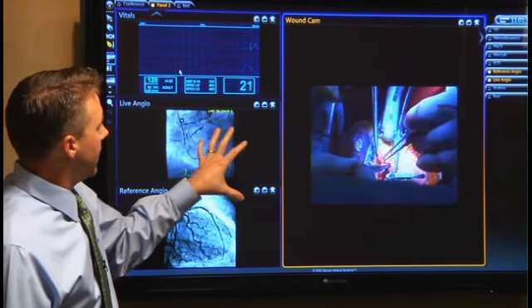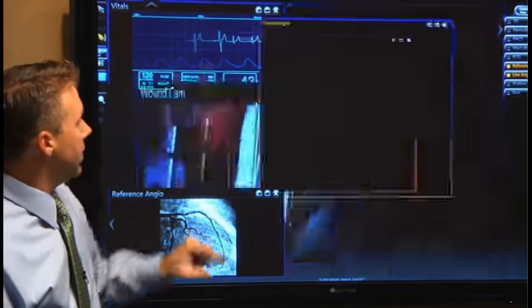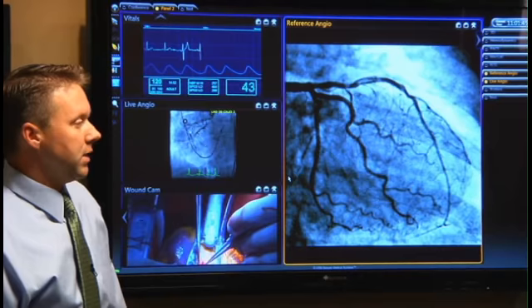Each panel has got content I can load up dynamically. I can change the layout of that, and I can blow it up, expand it, and so forth with very little effort using either drag and drop technology or using the specific buttons that are there.